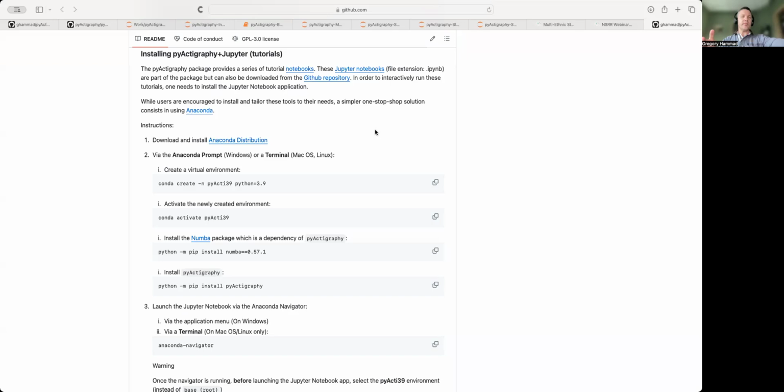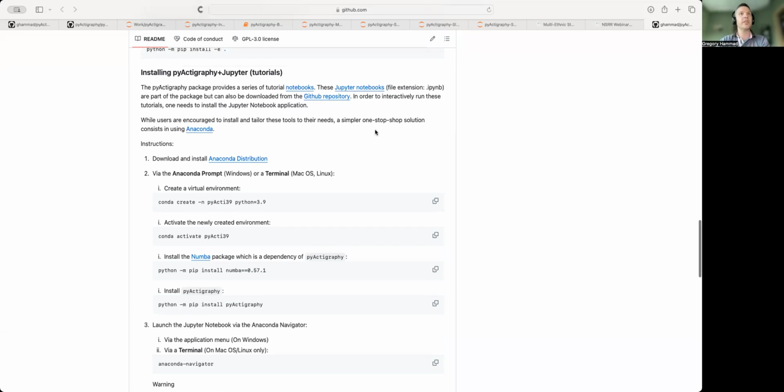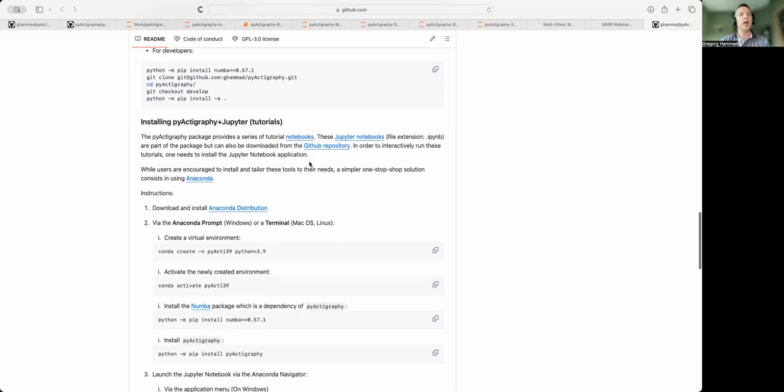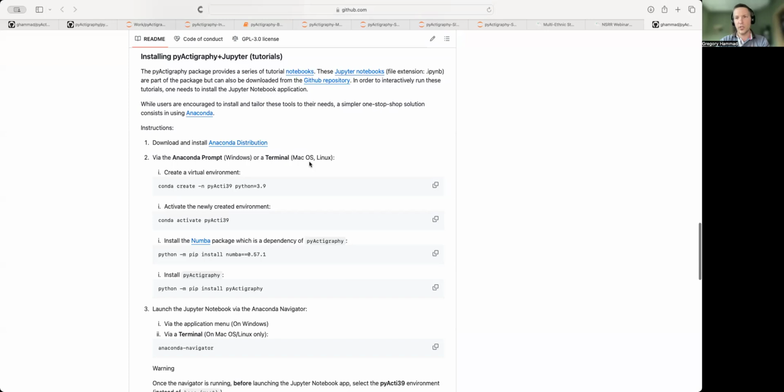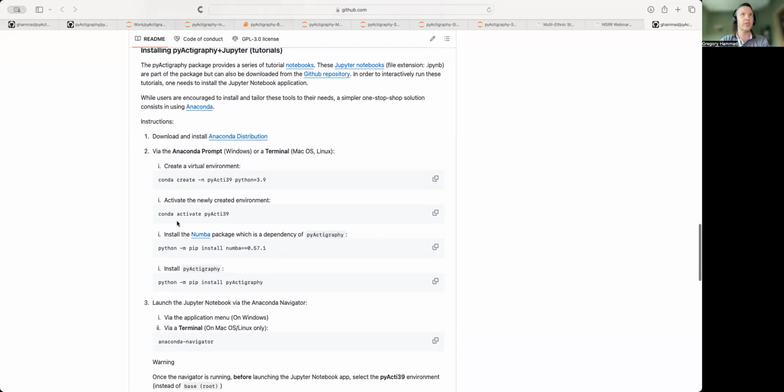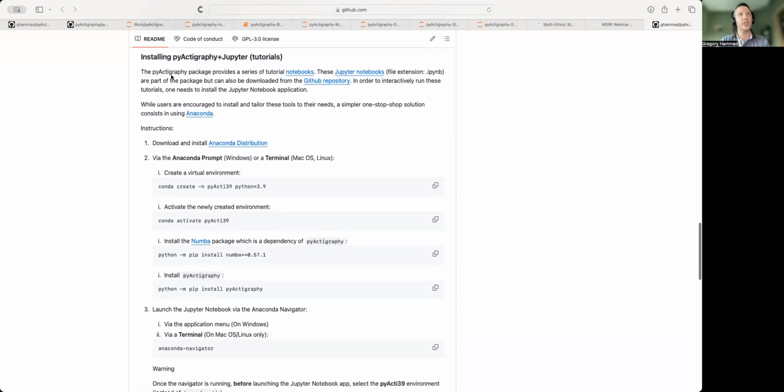If everything is successful, you should be in front of a subsection of the installation procedure that we have with the toolbox. This is the online documentation that we set up. It contains a lot of information, and we crafted the installation for the tutorial.